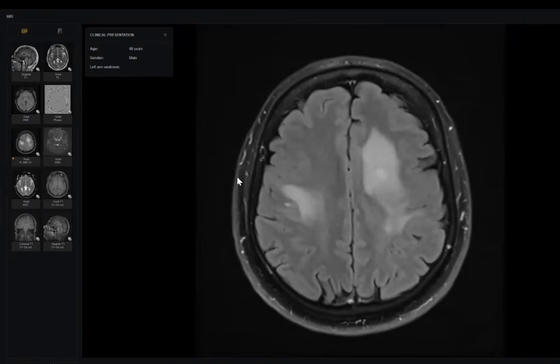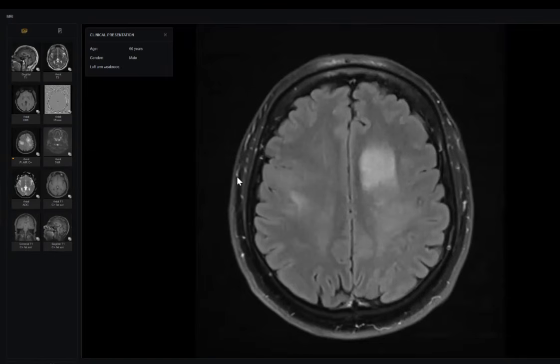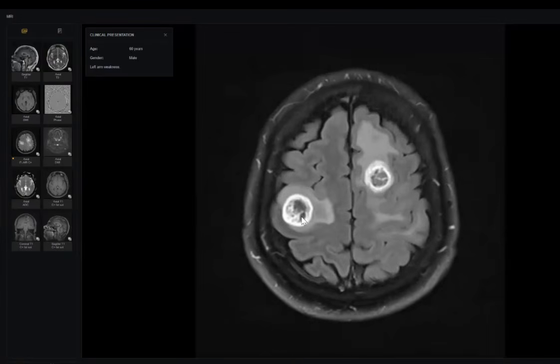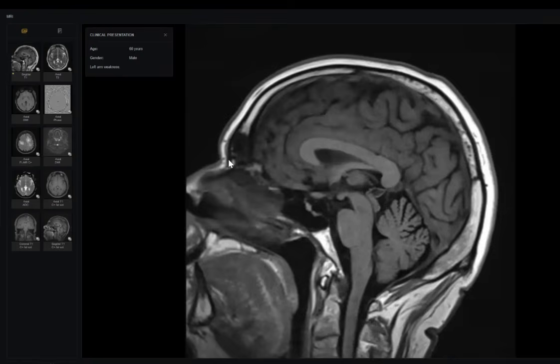Okay, what else? And this can be toxoplasmosis. Okay, but do you think toxoplasmosis has this extensive non-uniform mural enhancement? Do you think that? No. So most likely these are metastatic deposits.